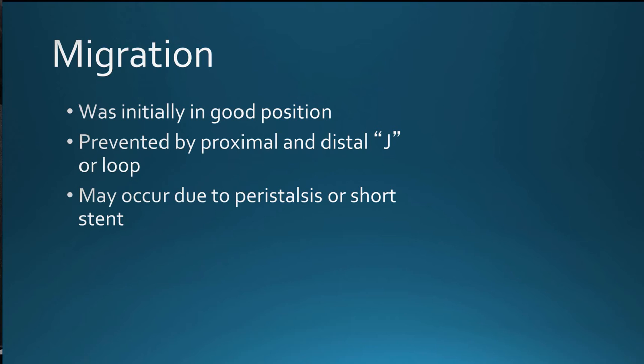Migration is somewhat different in that the stent was initially in an appropriate length and position, but subsequently migrated out of good position. Again, the kidneys move with inhalation and exhalation, the body moves, the bladder empties, a lot of motion there that creates a situation where the stents, despite the proximal and distal constraining coils, may move.